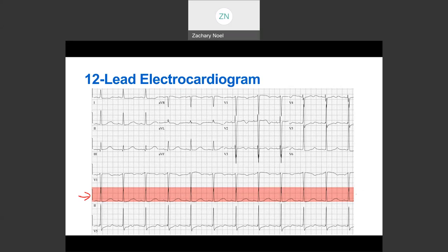And so lead 2 is what I want to draw your attention to. Lead 2 is kind of the best overall electrical picture of the heart, so to speak. If you're able, finding lead 2 is usually a safe place to nest. So if you can find lead 2, just direct your attention and focus on that for the rhythm identification portion. That's true for telemetry monitoring. That's true for the 12-lead electrocardiogram.